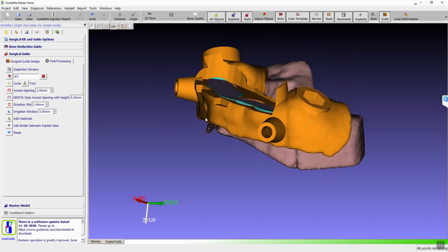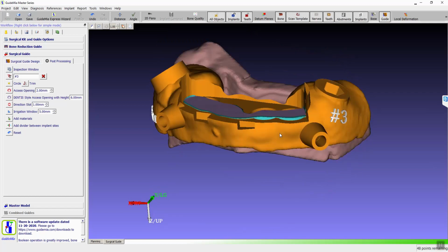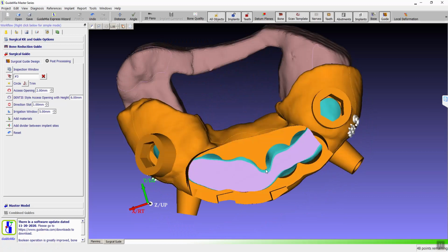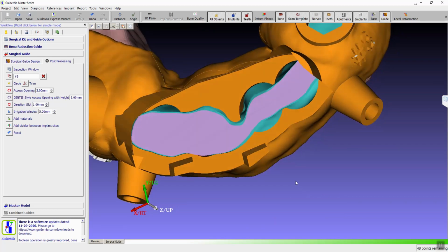Look straight down, so we're looking directly at where the bone's going to be cut. Flip it 180. There we go. See that protrusion? Flip it 180 from that. There's one piece right dead center that pokes into the bone. The guide? Yeah. Would we be able to trim that if we wanted to?